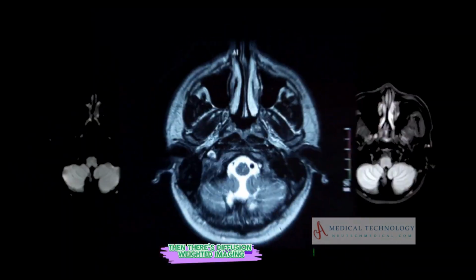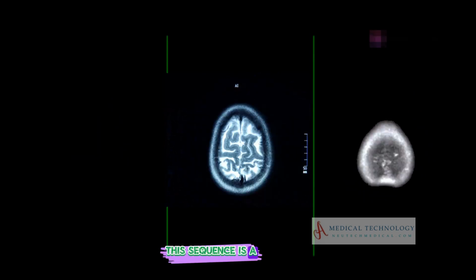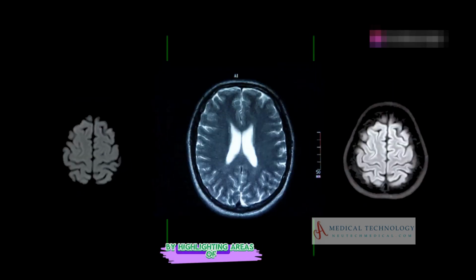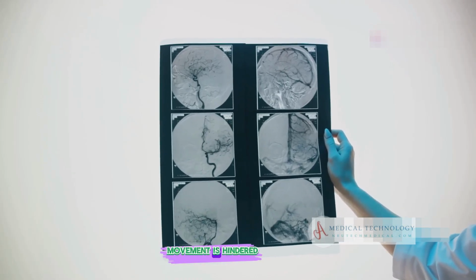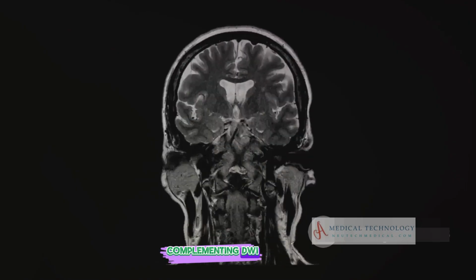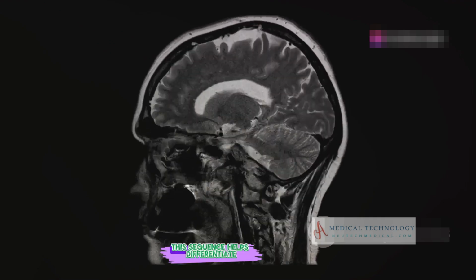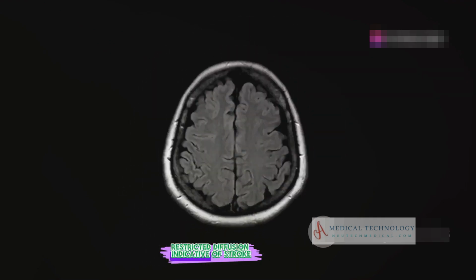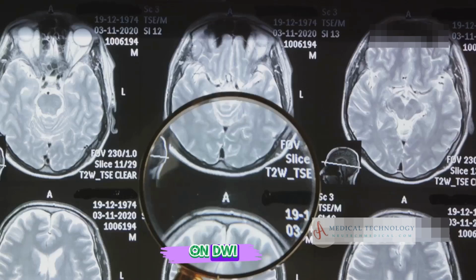Then there's diffusion-weighted imaging, or DWI. This sequence is a game-changer in detecting acute ischemic strokes by highlighting areas of restricted diffusion, essentially areas where water movement is hindered, which often indicates stroke. Complementing DWI, we have the apparent diffusion coefficient, or ADC. This sequence helps differentiate between true restricted diffusion, indicative of stroke, and T2 shine-through, which can mimic stroke on DWI.